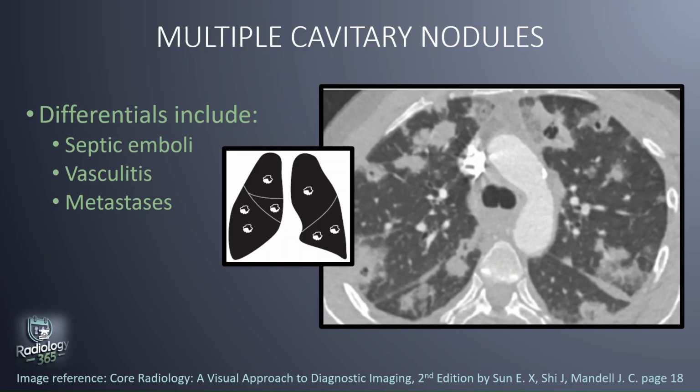So this axial CT shows numerous cavitary and non-cavitary lesions. You can see some cavitary lesion here, another one here, and we see the peripheral distribution of these cavitary lesions, but there are some non-cavitary lesions as well, and it's bilateral and it has a random distribution. This was a case of polysubstance abuse and septic emboli.